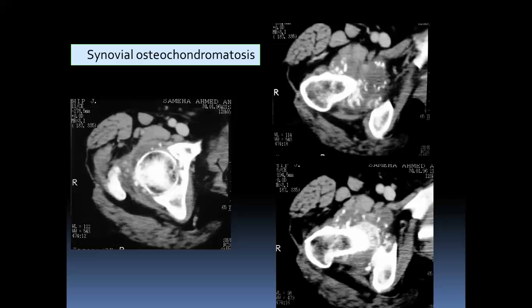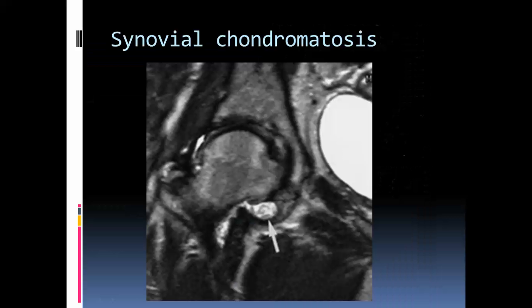In osteochondromatosis, you will find multiple loose bodies within a large synovial cavity. Multiple calcific loose bodies within a large synovial cavity start either as cartilage or fragments, which soon calcify and form this osteochondromatosis. Synovial osteochondromatosis is seen in MRI as low intensity.